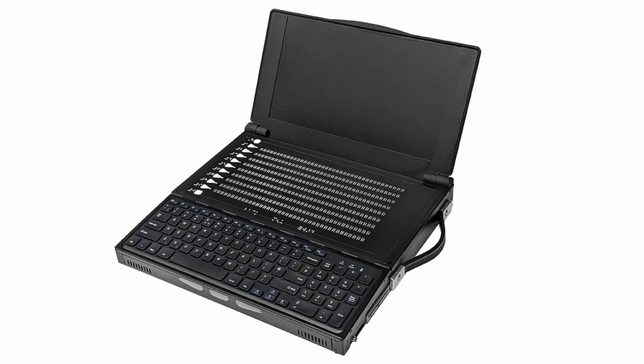So, for example, let's take a look at what is a checkbox. Well, a checkbox is an element on the form that the user can select. And out of all the series of checkboxes on the form, the user can select as many or as few as they wish. Therefore, the checkbox has an additional field known as checked, which can be set to either true or false when the form is created, and its value can be changed when the user interacts with it.